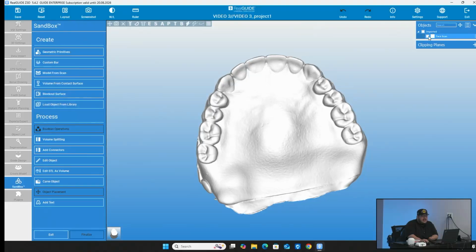As you see here, on the top right side, we have only one object, and that is our denture. But if we edit this denture to become a tissue scan, we will lose this. And of course, we can definitely go back to where we found this original scan and bring it back in and realign it to the CT scan. But to save ourselves some time from doing that, we're going to duplicate this.